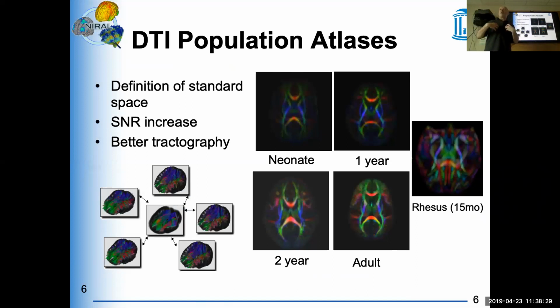In generally our analyses, we use this atlas space that we computed, that 1- and 2-year-old space, as a prior to build the new atlas in, so that we have all atlases built in a similar reference space.